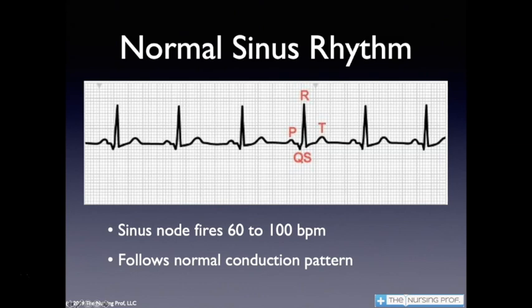Next, we're looking to see whether or not it's regular. Yes, it is regular. It's firing off regularly, and you're going to see some examples of ones that are not regular, and then that'll really point itself out. You'll say, oh boy, I can understand what's regular and what's not. Are all the complexes preceded by a P wave? Well, yes, in fact, they are. So there is a P wave in front of all of the complexes.